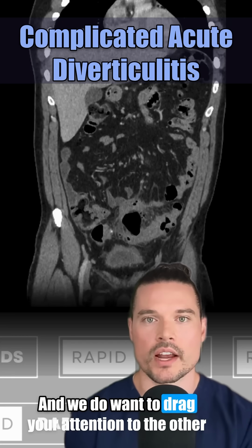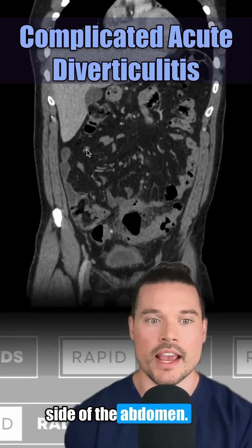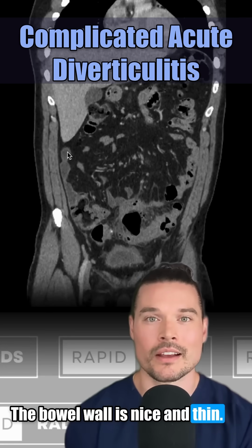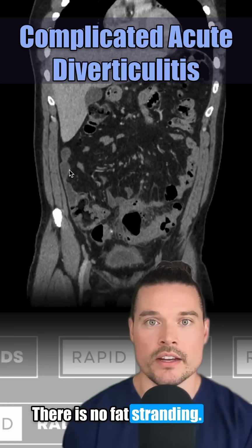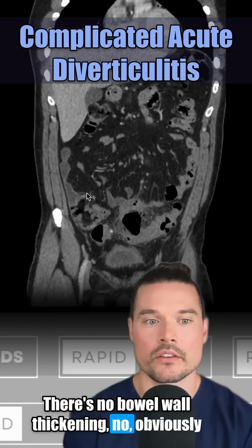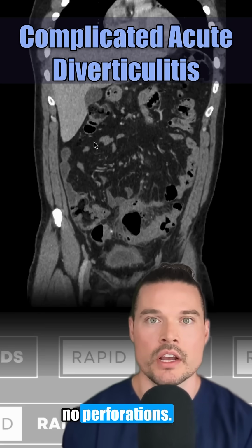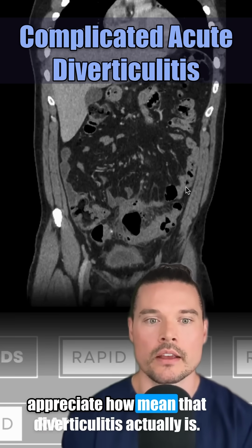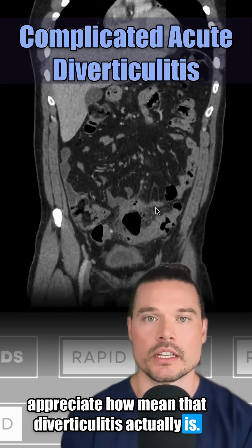And we do want to drag your attention to the other side of the abdomen. Look at that ascending colon. The bowel wall is nice and thin. There is no fat stranding. There's no bowel wall thickening, obviously no perforations. So we can use that as a reference point to just really appreciate how mean that diverticulitis actually is.